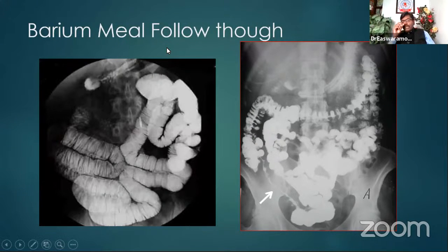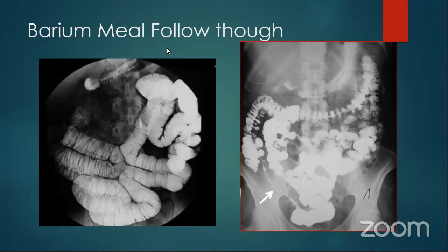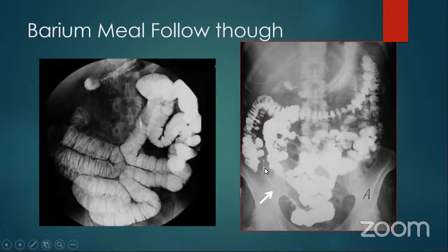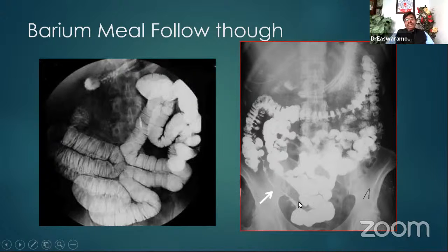Do you see any abnormality in a young chap who presented with recurrent abdominal pain and diarrhea, and we did a barium and it showed something? The arrow is also trying to help you. What do you call this sign? Sir, ileocecal stenosis. Yeah, it's a string of Kantor. String of Kantor is a long, narrow, smooth structure involving one foot of the terminal ileum.